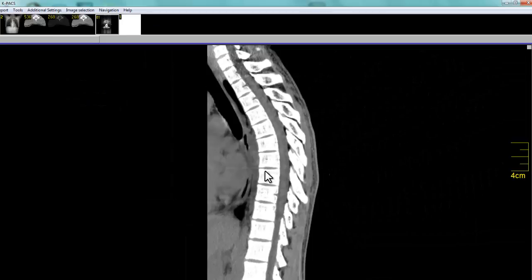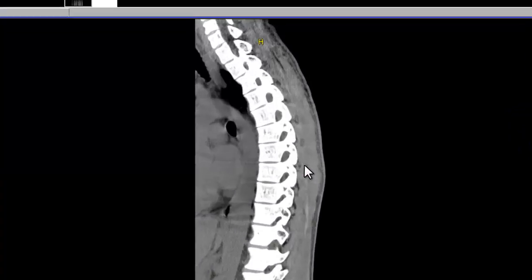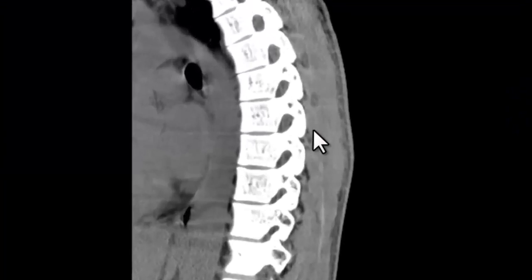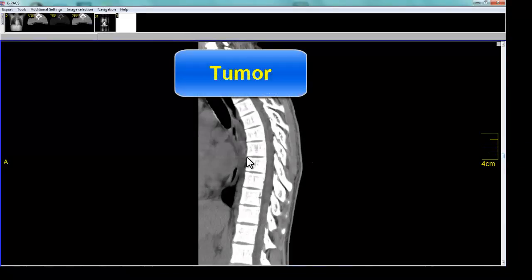Infection can also affect the paraspinal soft tissues. So here's your posterior elements, but it can also spread all the way back into the soft tissues. So if we go a little bit parasagittal here, these are all your paraspinal soft tissues on the side here, and paraspinal soft tissues here. And infection can also spread to these spaces. So that finishes up some pointers about infection.